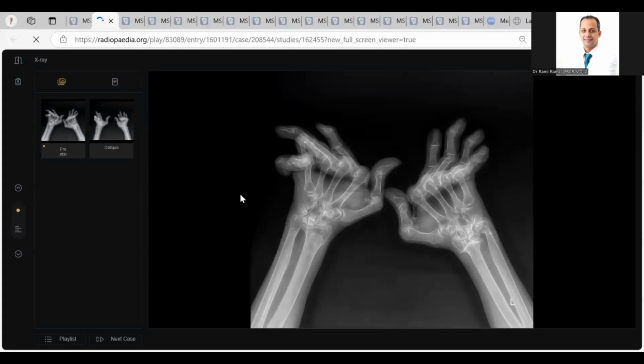Yes, after that, in this case, this is a classic rheumatoid, old age female. Okay, you hesitate sometimes. You told me at first this is Jaccoud arthritis. Don't expect in the FRCR exam that any examiner will bring you Jaccoud arthritis. They want some disaster. They want you to pick up and to save the patient. And then you didn't ask me to zoom. I know here we didn't have a zoom option, but in the exam you have. Asking for this is very good for the examiner.